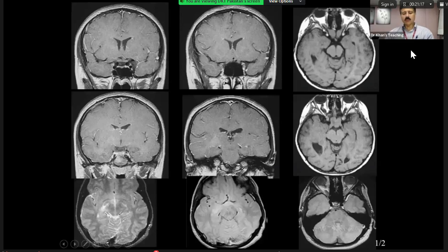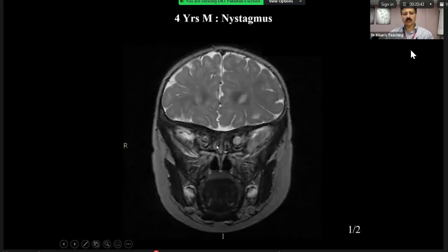Okay, very good. On an axial slice, our examiner is going to show you on axial, right? And you can see this, it goes into the optic chiasma. Now on this one, you can see there is a bit of high signal on this T2. If you compare it here on the post contrast, it goes to the lateral geniculate body, which is next to the thalamus. So the point I'm making is that it can go backwards, right? Now look at this case.